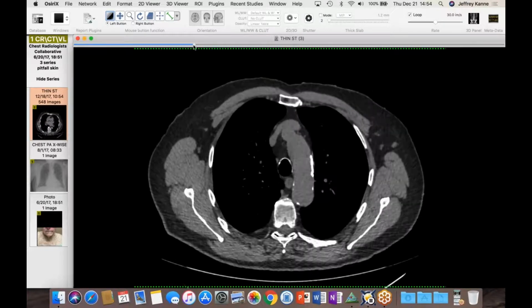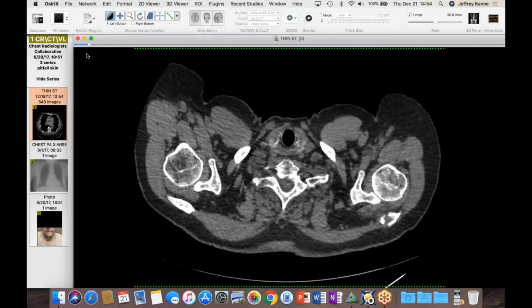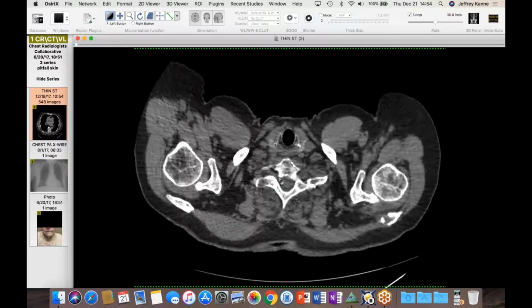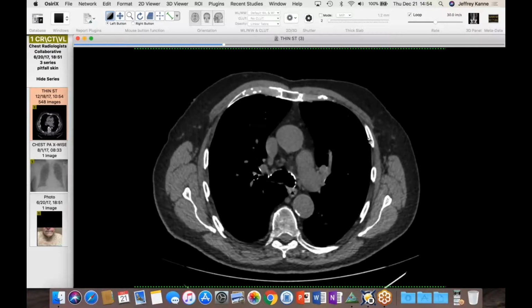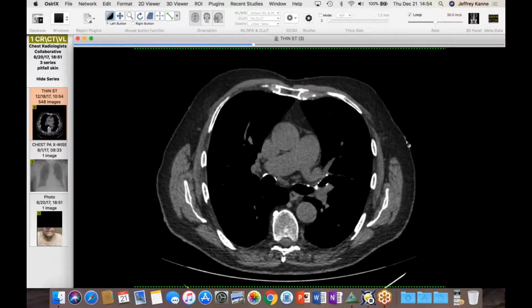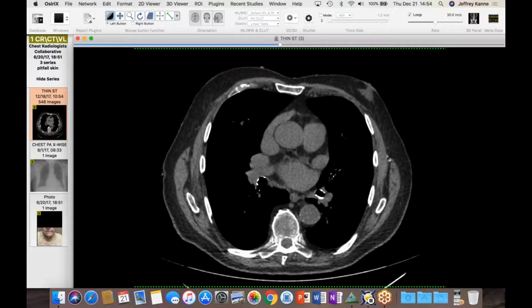And he actually does have a bone metastasis involving, if I remember, the scapula. Yeah, he's got a lytic lesion right there. But that aside, the reason I'm showing this case is he's got all these cutaneous nodules. So obviously they could be mets, but I was wondering, could these be neurofibromas? But in thinking about it a little more and getting a little more information, I remembered that neurofibromas are deeper in the skin, but it's hard to tell because some of these do protrude down there. And so I thought this guy might have had NF1 or something, and they just didn't bother to mention it.